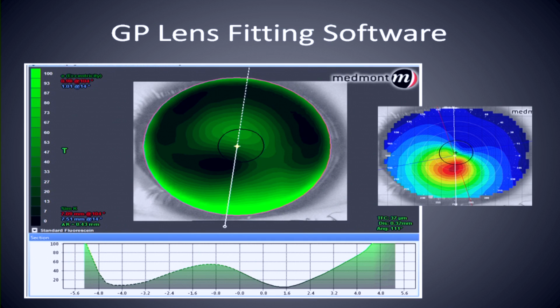Well, let's drop a theoretical lens, a theoretical RGP, and assess the fluorescein pattern. And what the GP is telling me is, yes, this is a high point on the surface. When you run this white axis line through this meridian and look at the tear layer up at 12 o'clock, and then right through the apex, just over the cone, there's a very thin amount of fluid, and then lots of inferior edge lift. But this is a high point, but so is all this.